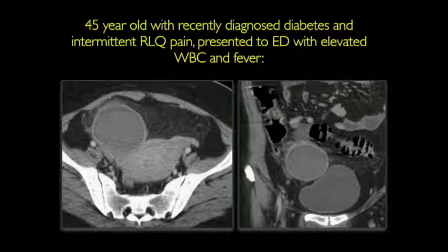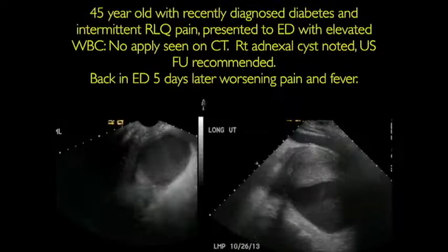Now sometimes this can be a pitfall, as it was in this case. This was a CT that came through the emergency room: a 45-year-old, recently diagnosed with diabetes, with intermittent right lower quadrant pain and an elevated white count. They said the appendix is normal, there's a cyst in the adnexa, maybe follow up as an outpatient. But notice there's a thickening of the cyst wall and a lot of stranding, and I don't know that I would really leave that. And also, what then was the cause of the right lower quadrant pain?